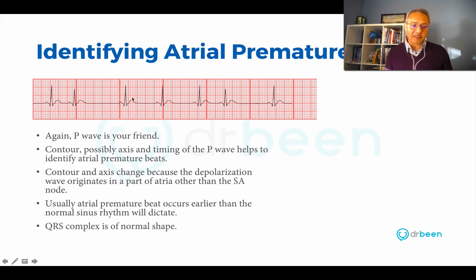You can actually visually see that the QRS complexes seem to be a normal rhythm, this is normal rhythm, but beat number 2 appeared earlier and beat number 6 appeared earlier. But look at the QRS complex itself, it is normal. The P wave almost seems normal as well. This is a hand-drawn EKG, so that is why the P wave is normal.